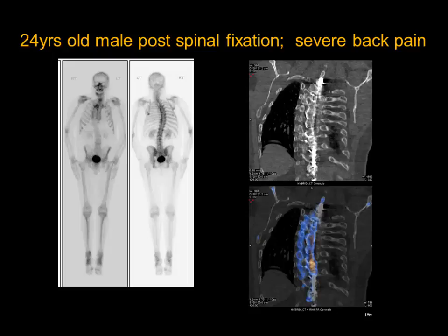But generally, if you're reporting a planar scan, you know there is scoliosis, so you describe the scoliosis, thoracic on the right hand side and lumbar on the left hand side, and then you know that there is a kyphotic spine, and this is the turning point. It's coming like this and then it bends. So this is the pressure point here and here. So you've got degenerative, most likely degenerative changes.